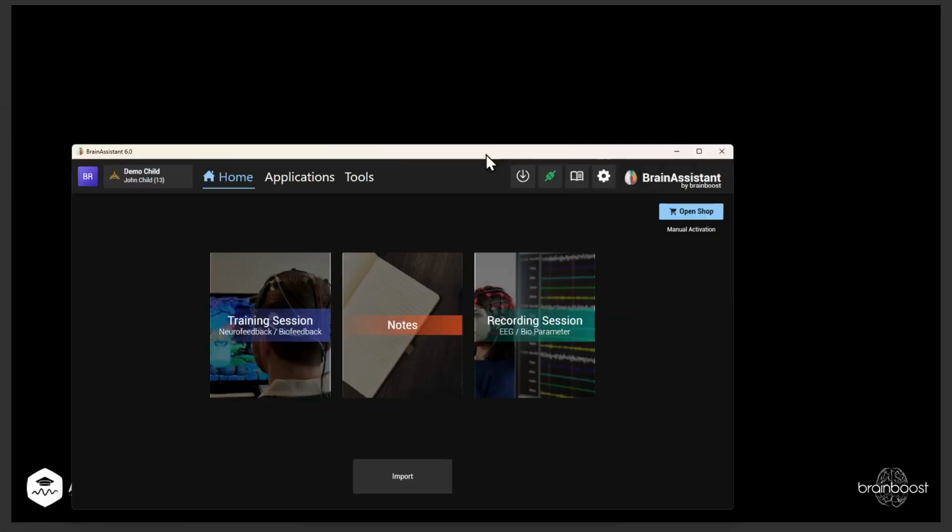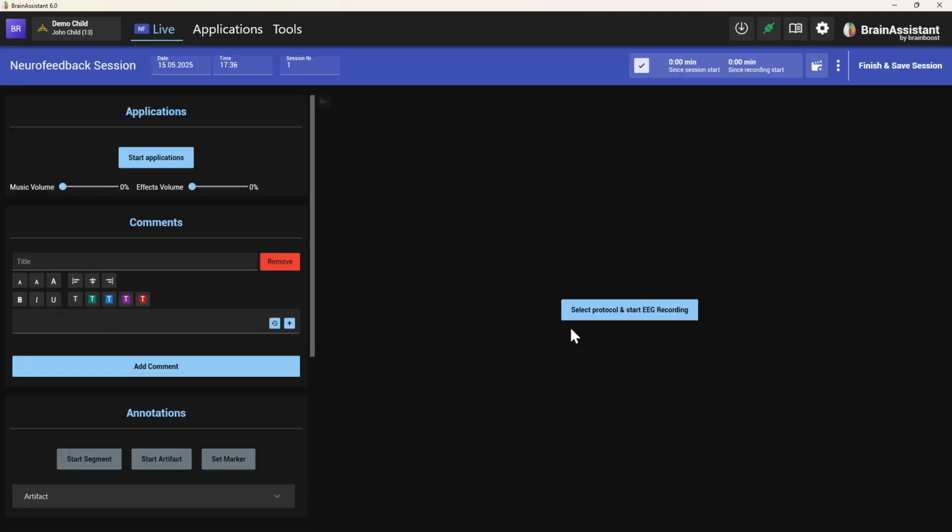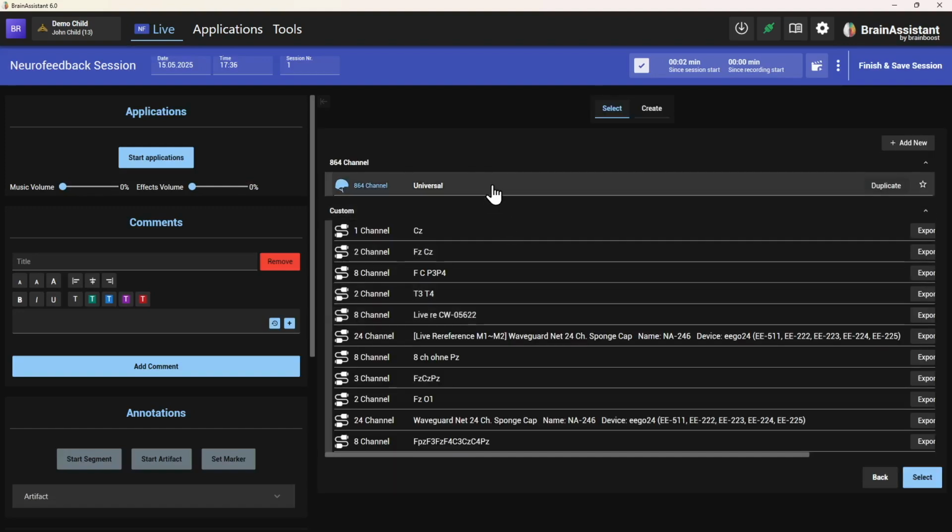So I started my BrainAssistant already, so I have my John Child user, my demo client, and we don't actually even have to use a recording session creating a report. We can also use these tests, and this is what I'm going to show you, with a training session. So let's say you want to do a training. I'm going to start a training session. I select a protocol. I'm going to use this one.